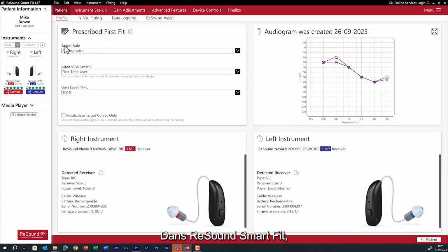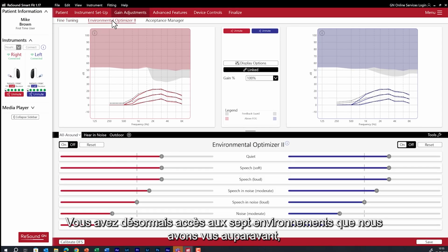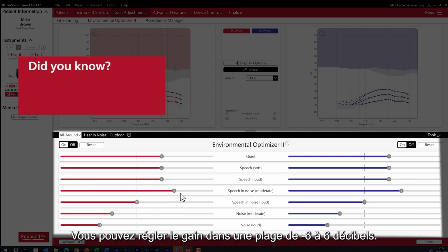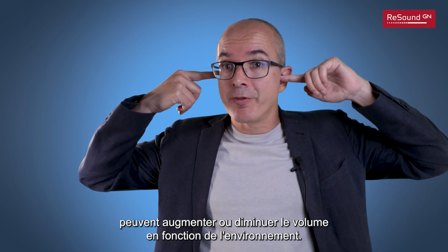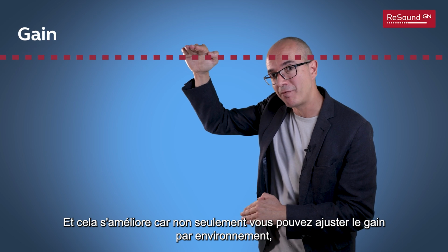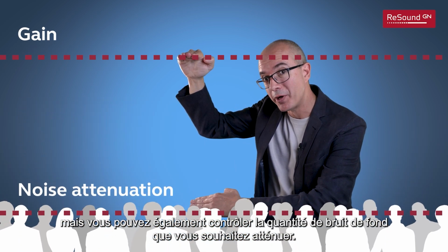In ReSound Smart Fit, go to Gain Adjustments and you will find the Environmental Optimizer. Now you have access to the 7 environments that we saw before, from quiet to loud noise. You can adjust the gain within a range of -6 to 6 decibels. It is like an automatic volume control where the hearing aids can turn the volume up and down depending on the environment. And it gets better, because not only you can adjust the gain per environment, but you can also control how much background noise you want to attenuate.